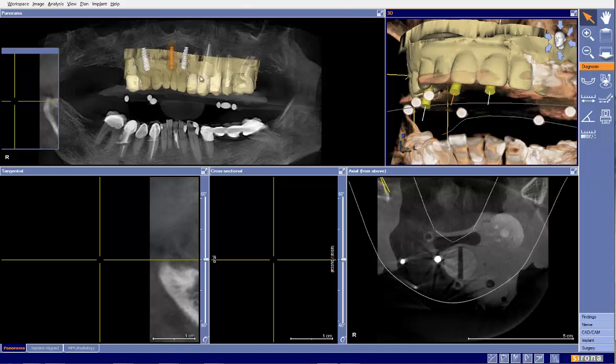So this is a great option. When we start looking at overdentures or overpartials, we start having to evaluate the use of either locator abutments directly to the implant or the use of a bar. The bar brings in, especially on a case like this, lots of space issues and different things like that.